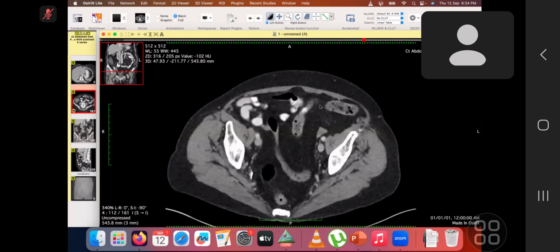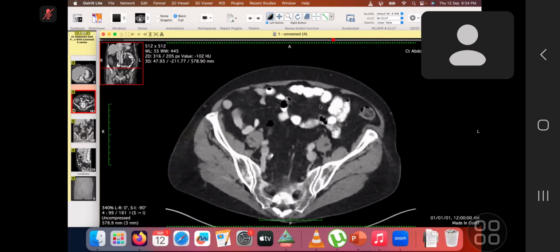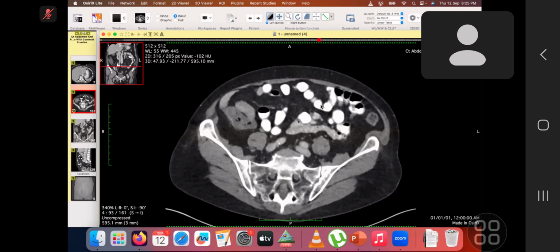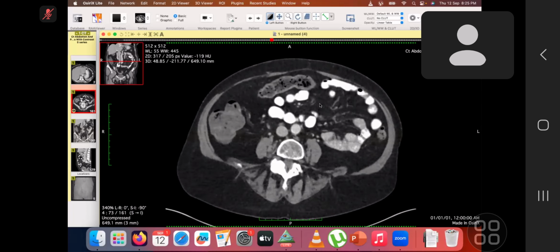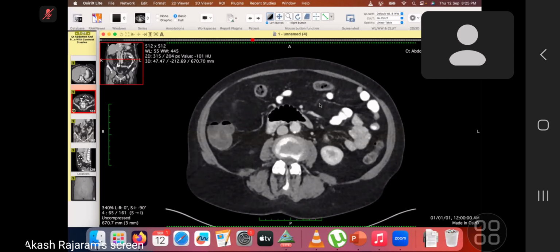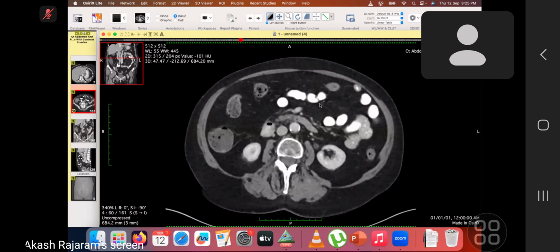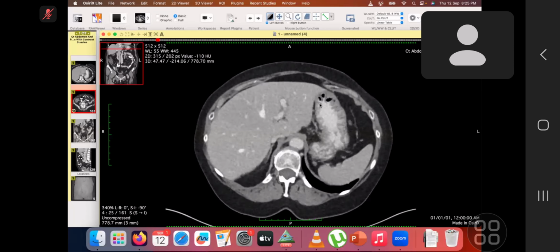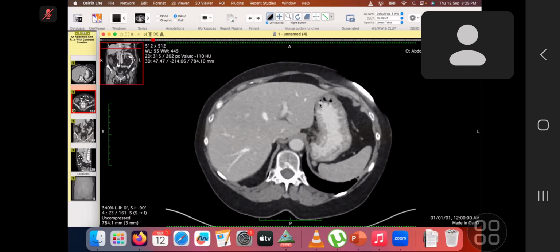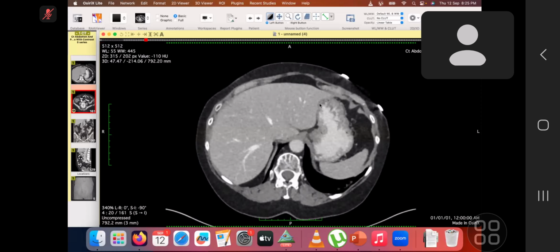I think that there is fat accumulation around the rectum and the sigmoid, maybe representing pelvic lipomatosis. Also, I will screen through the other upper cuts, to see if there is any abnormality.